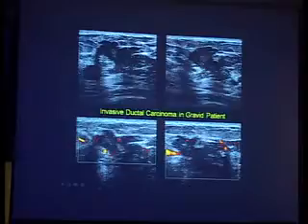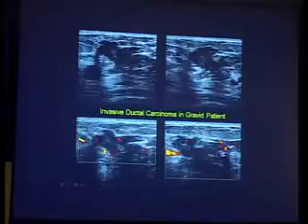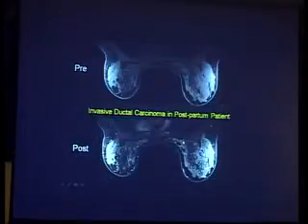Okay, so it's always benefits versus risks in patients, and at least in the setting of breast MR, the benefits do not exceed the risk. So I would say we almost never do breast MRI in pregnant patients. Okay, so she was close to, it's the third trimester, close to delivery, and this is her after her baby was born to take care of her diagnosed invasive ductal carcinoma. So breast cancer in the gravid and postpartum patient.